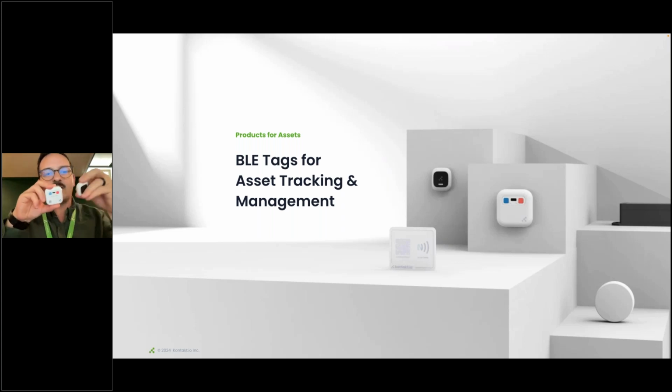The next and kind of our most utilized device is the Asset Tag 2 Mini, aptly named. Much smaller than the first one I'm showing, and this goes on really everything. IV pumps predominantly, wows, telepacks, wound vacs, kind of just pick out a device at random, and this will be the one that we've been affixing to it. Really great battery life. Does also have a programmable button, just one, so we can't do a whole lot of different things with it if we're trying to get a little crazy, but I'll talk about how we can automate workflows without having to even press buttons, which is very exciting once we get into the live demo.